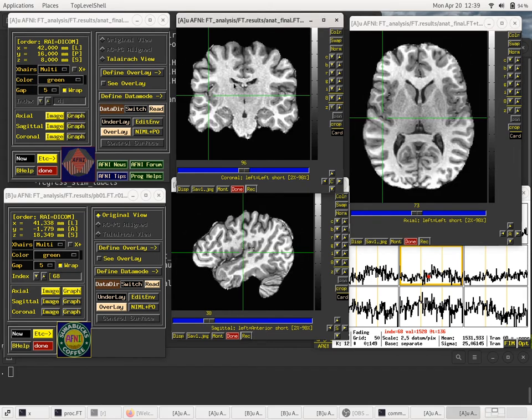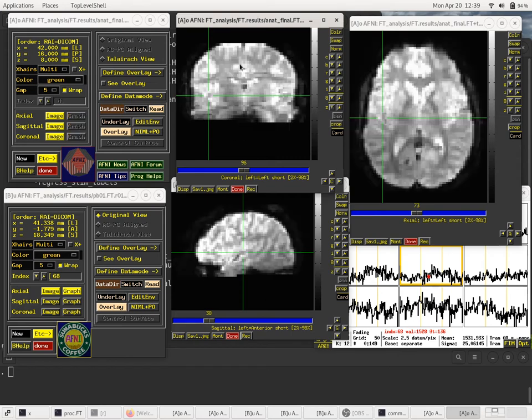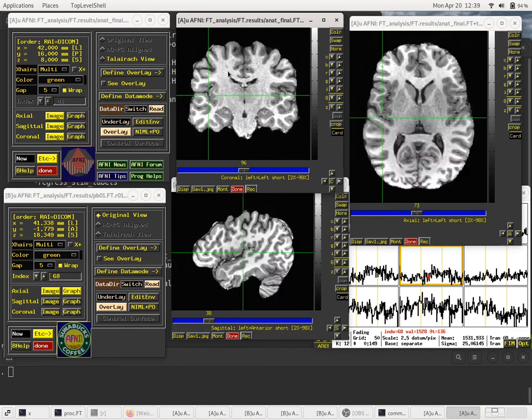And one thing you can look for, sometimes we evaluate right versus left. Here you see an asymmetry between the left and right in terms of the folding patterns. This goes in higher up, and this goes in up there, and it goes in down here. If we toggle the U key, the brightness patterns match that a little better.